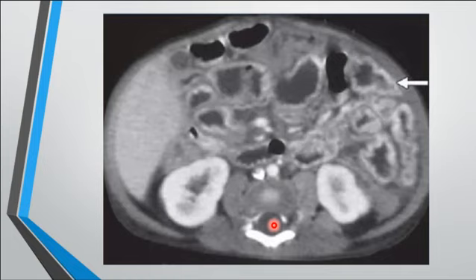This was a case of hemangiomatosis. There are diffuse hemangiomas involving the whole bowel, resulting in this intense post-contrast enhancement. You can see his young age, maybe a child, with diffuse post-contrast enhancement involving the entire small bowel due to hemangiomatosis.